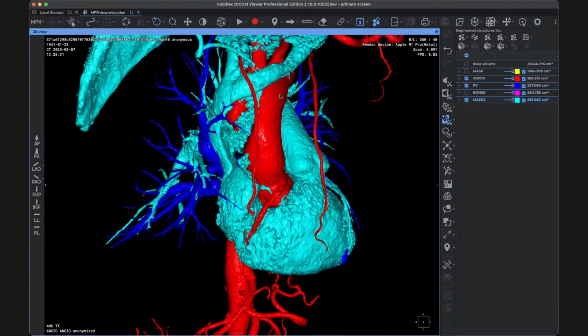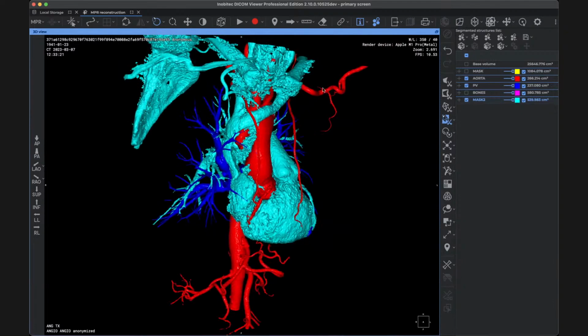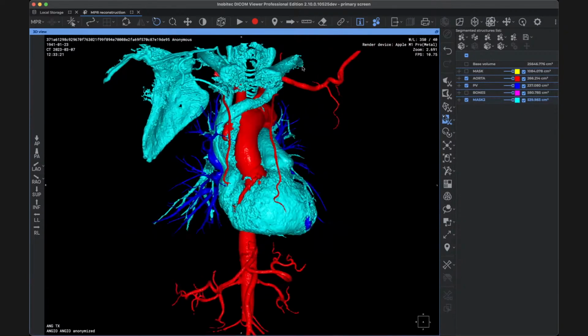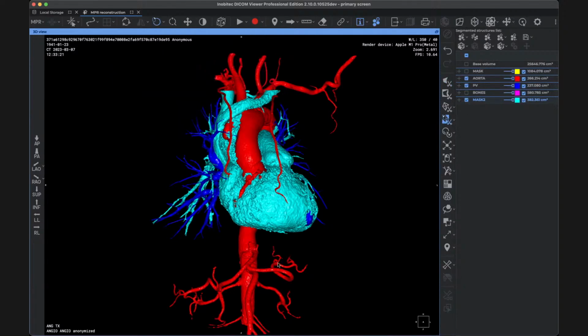So what we're gonna do now is to separate the pulmonary artery from the vena cava. That is right here. And also there are some structures here that we don't want. We can cut this thing out. We can use the scissors to disconnect them and clean. It's okay. So I'm going to create two more masks here, one for the pulmonary artery and one for the cava.